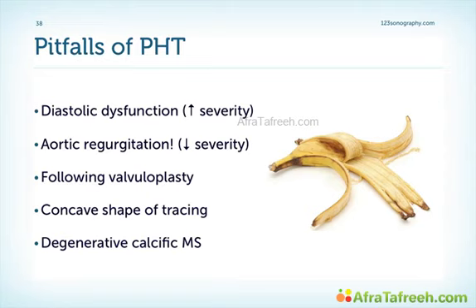And the compliance is reduced in diastolic dysfunction. So you will have a fairly flat curve, or you at least have a longer pressure halftime in the setting of diastolic dysfunction, and that can lead to overestimation of the severity of mitral stenosis. As a result, you should not use it if you have diastolic dysfunction or if you suspect diastolic dysfunction.